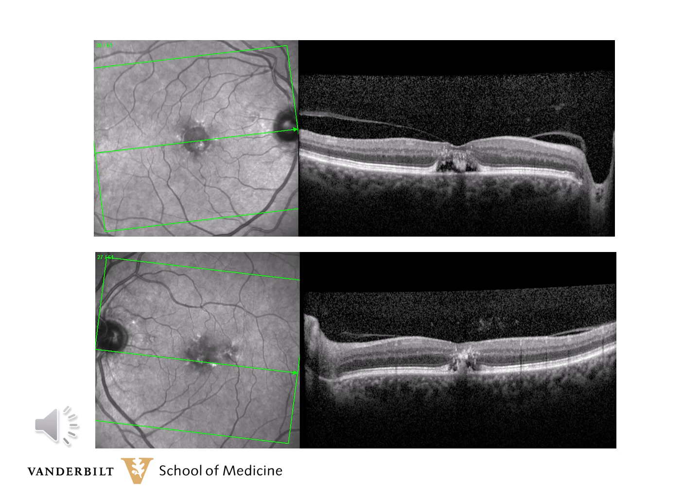And here are some more OCTs of that same patient. Now, these OCTs are taken 7 years after the first that we presented. You can see that the right eye has more liquefaction with some hyperreflective areas in the subphotoreceptor area. The left eye also shows some of this hyperreflective material as well.